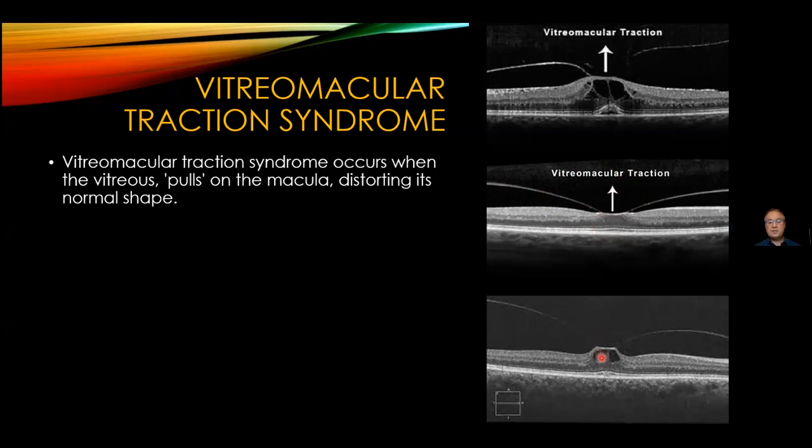If we go to this, I'll show you a little bit later, this could be classified as a stage 1A macular hole. Again, often the patients have very little symptoms, if any, with that. As soon as they start having the outer part of the retina and the photoreceptors distorted with the amount of traction, they will start having, again, smaller images, the micropsia, bent lines, the metamorphopsia, and their best corrected vision will deteriorate.